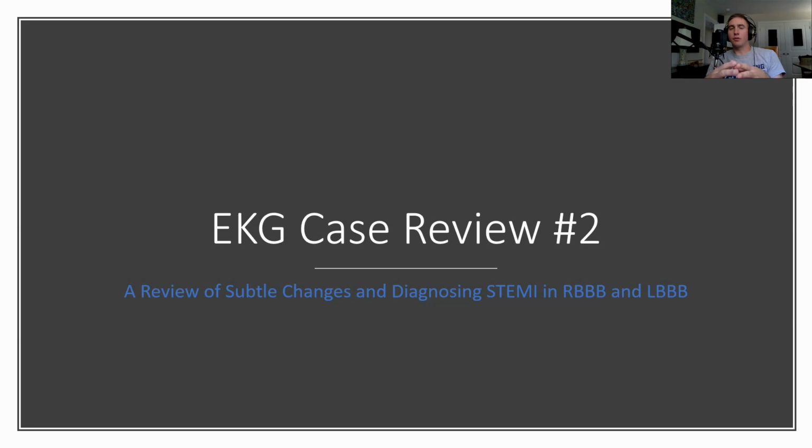Let's get started on our second EKG case review. I hope that you enjoyed our first one that we did a month or so ago, and I'm going to try to put these out at regular intervals. First thing we're going to do is review some subtle changes, kind of like we talked about in our last video, but we've had more cases that were very interesting, and I think that we should review those.